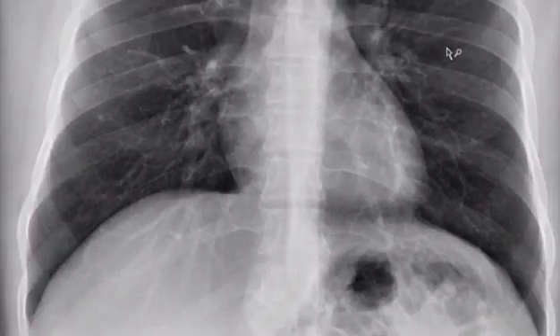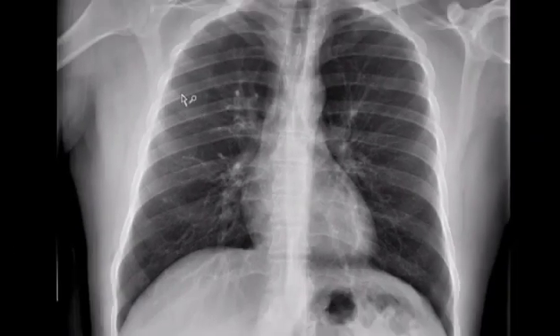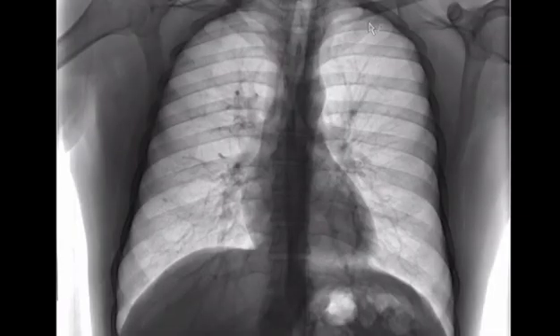But then what I do is I go down to the lung bases, because sometimes you can have a nice linear pleural line down here, which would indicate a basilar component of a pneumothorax, or even a loculated basilar pneumothorax down here. Sometimes if I'm having trouble deciding if there's a pneumothorax or not, I can switch to the inverted windows, which can sometimes give you a nice contrast between the pleura and the adjacent ribs or whatnot.